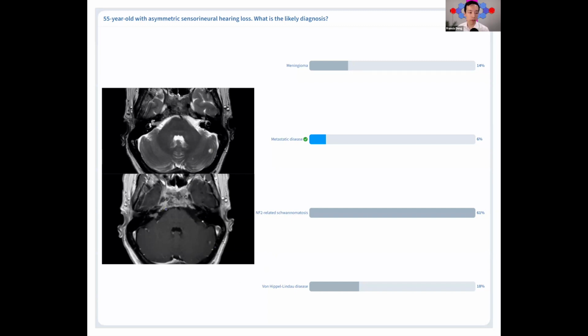Some of you may also have noticed a very irregular contrast enhancing appearance to the clivus here with thickening of the retroclival dura. This represents osseous metastasis with epidural extension. So NF2-related schwannomatosis, the appearance of that would be bilateral vestibular schwannomas, which would appear as contrast-enhancing lesions in the internal auditory canal. And you may also have meningiomas, but you would not have these brain parenchymal or osseous findings.